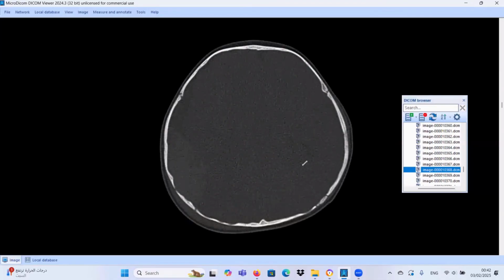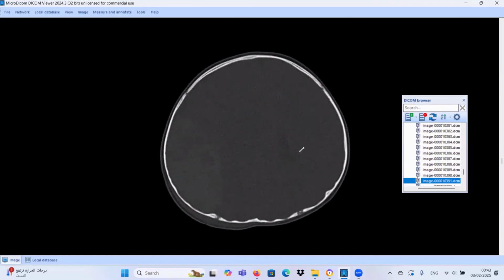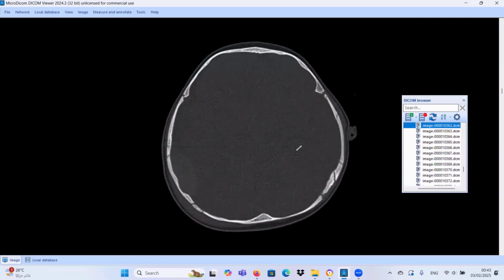This is the coronal suture on both sides, and this is the lambdoid suture on both sides. So don't miss this and don't misdiagnose it as a fracture. But if you go slowly, you can find this small line, which indicates a fine fissure fracture in the right parietal bone, and this should be confirmed in the 3D image.